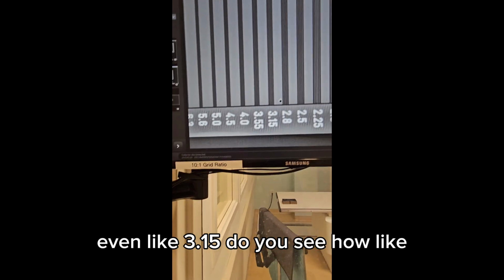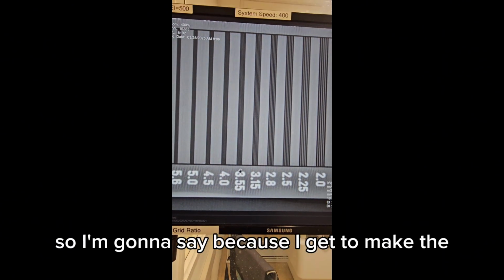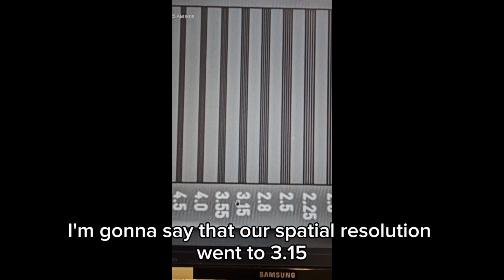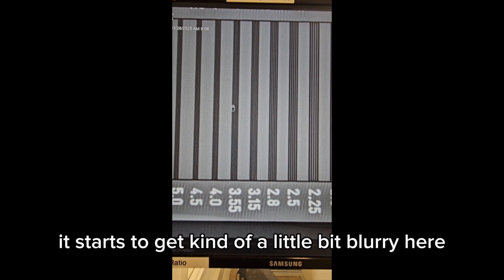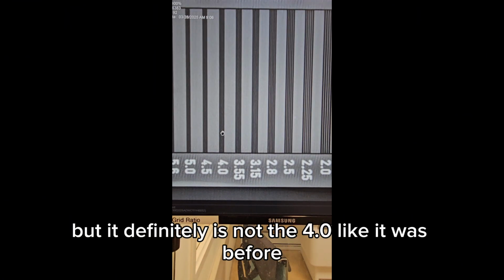Do you see how spatial resolution has changed so much by just adding OID, right? So I'm going to say, because I get to make the decisions here, that our spatial resolution went to 3.15, because I can definitely see all 5 of those lines. It starts to get a little bit blurry here at the 3.55. But it definitely is not the 4.0 like it was before, okay?